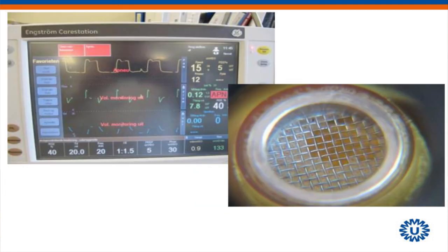Last one. What do we see? Apnea, but not really. And no flow waveforms, and no volume waveforms. Any idea? Sensor dysfunction.